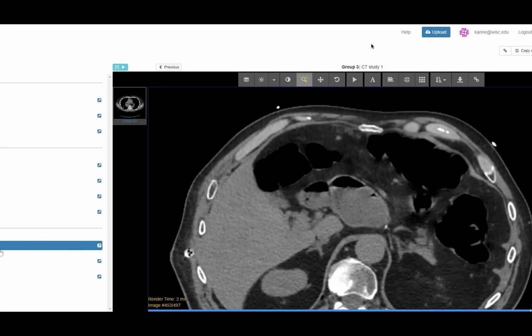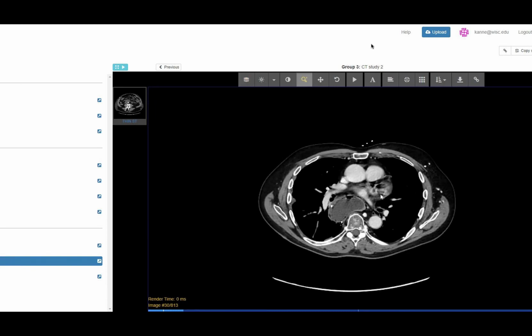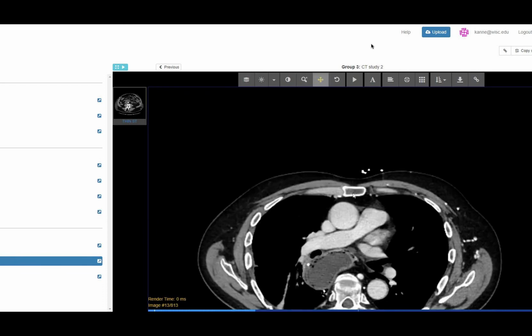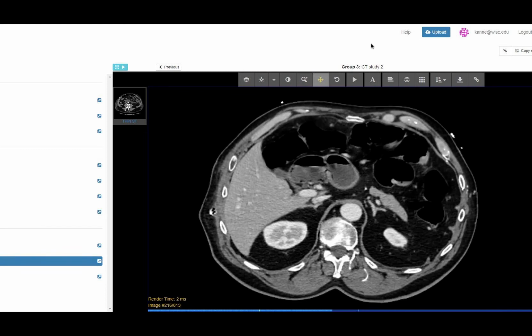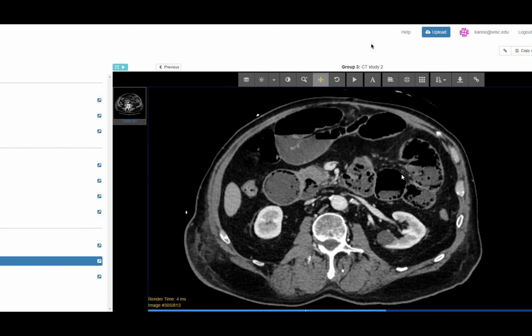And then I'll show you the belly CT. I think they actually did the belly CT first. Sorry, I'm using a trackpad I'm not familiar with. There we go. As I go down, you'll see the pneumatosis in the conduit, and then in the distal stomach, and even in some of the bowel here.